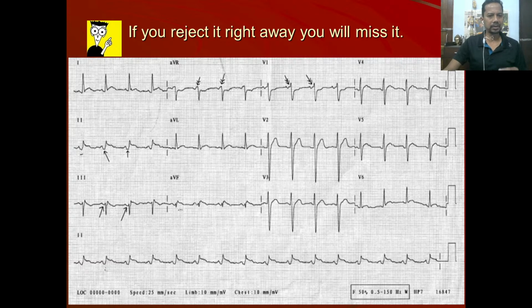This is the finest of the topics, and atrial MI we will never even think of if we are not looking for it. So whenever the patient comes with atrial fibrillation, think of atrial MI. Let the fibrillation settle down and atrial MI might be there. Sometimes the patient comes, you do the ECG, trop T is positive, ECG is normal. So think of atrial MI. This is another take home message. Trop T positive and ECG apparently normal looking. You look at the ECG again, don't make it an ego hassle that oh no, it's normal.